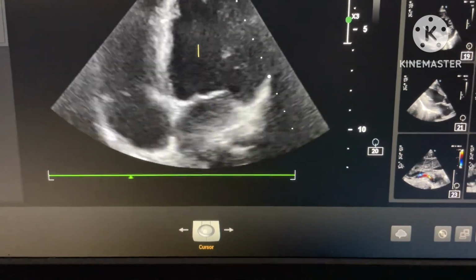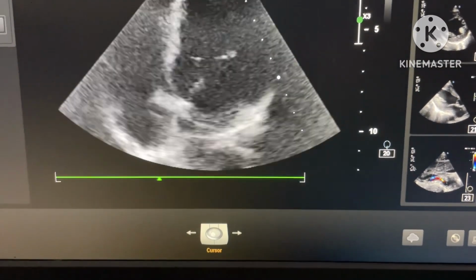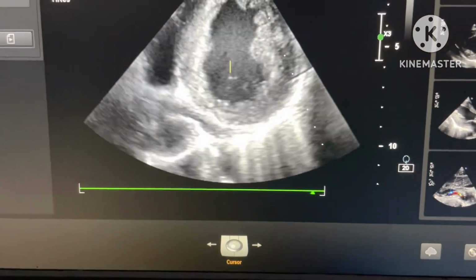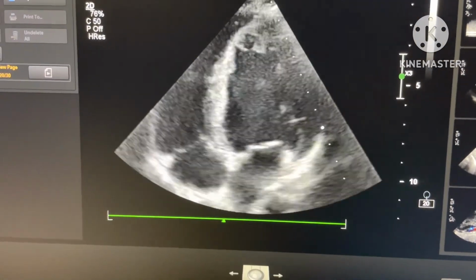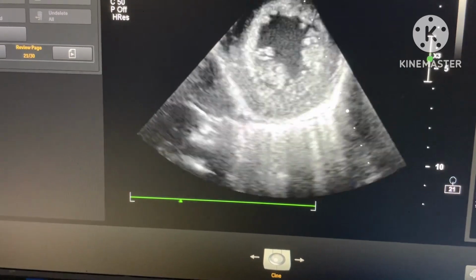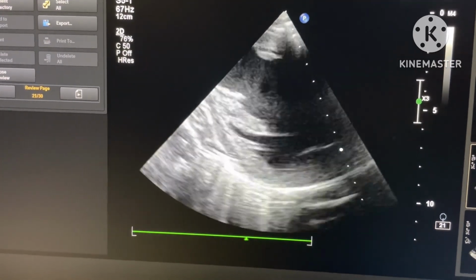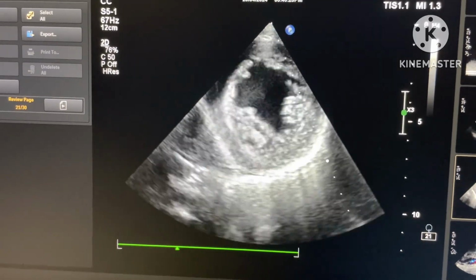This is the characteristic finding in ultrasound examination, which you see. That is why I have taken this case for a study. I will show you all that imaging. Again, you see the same thing: concentric LVH, prominent LV size, and ejection fraction at the lower normal side.